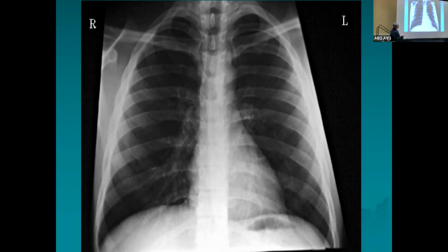Looking at my scapula, you can see right here, they come to the midline, they're parallel. I can see vertebral bodies all through here. On my picture, I can see it through here, but here it's obscured a little bit. On mine, I promise you I can see it here. Those of you who are looking at this one online, you may be able to see it a little bit better.